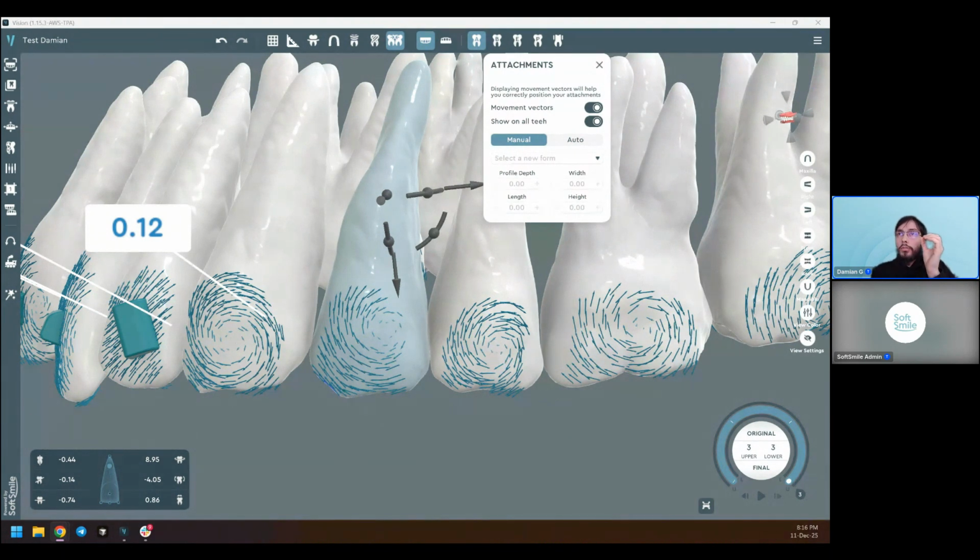What the circles or the arrows tell you is, if you were to pull the tooth, like grab a point on the tooth, where you should be pulling it to achieve the desired motion on the center of rotation, or it's a resistance point, right? That's what it is. It's not what the tooth is rotating.